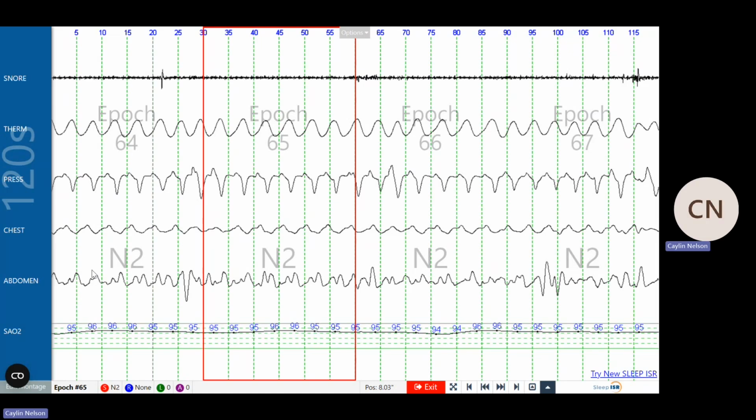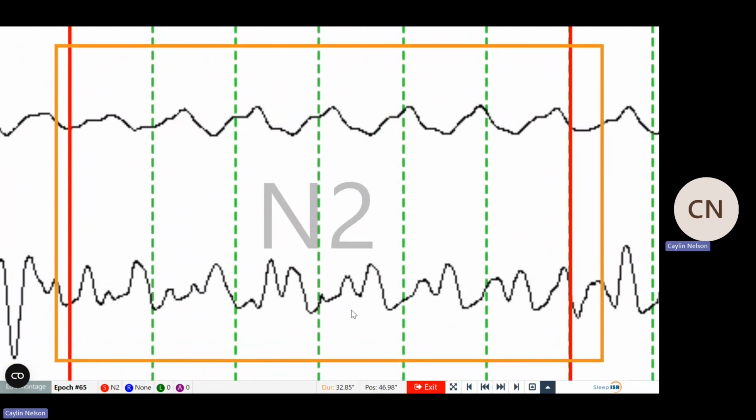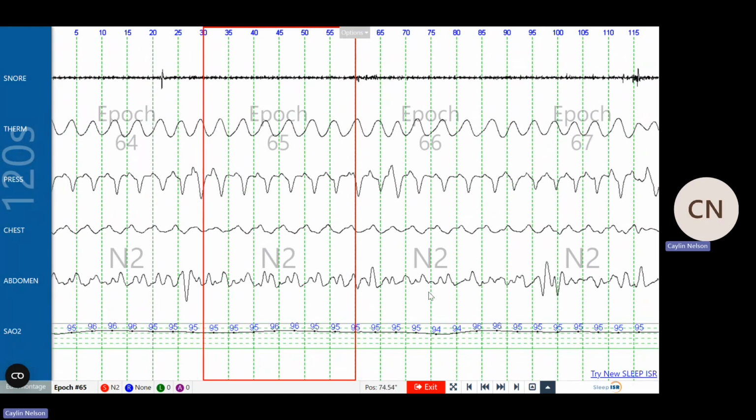It's a little bit more difficult to read than before, but remember, typically as long as we have at least one working respiratory effort channel, like that chest belt, that is pretty consistent, I would use that as a reference rather than the abdomen belt you see all this artifact in. So typically those have a distinct waveform. You can see in between where there are 2 or 3 small waves in the abdomen belt lines up with about 1 singular wave in the chest belt.